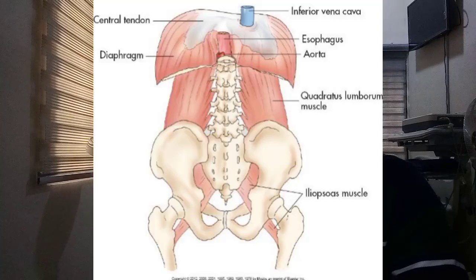And this is a sketch diagram for the posterior abdominal wall muscle. Sonographically, on longitudinal scan, muscles appear hypoechoic with the septations seen as oblique fine echogenic strands.